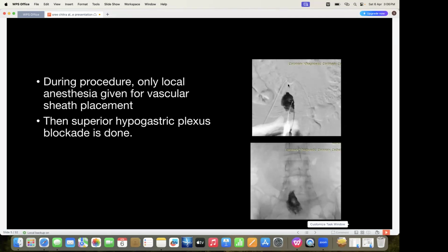The venous bifurcation will be slightly towards the right side and inferior, around the level of the L5 vertebral body. At around this point, we'll find the venous bifurcation, where the iliac veins join the IVC.